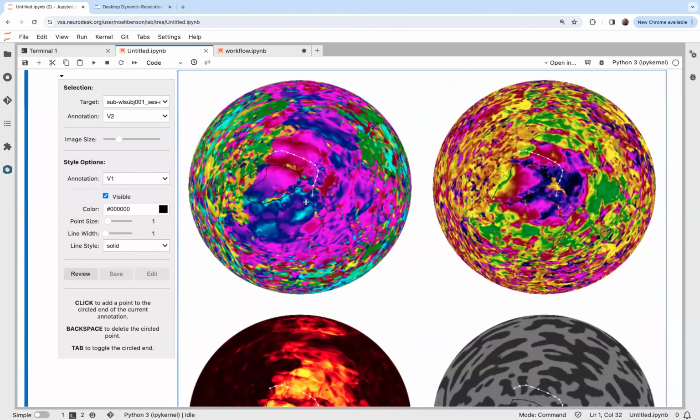So now I'm going to follow the same horizontal meridian representation down through here. Okay, so now we're ready to draw the periphery, and I'm going to do something a little weird, which is I'm going to follow this green reversal in the eccentricity map, and then I'm just going to go straight through V1 as if it didn't exist, or as if V2 actually overlapped with V1.